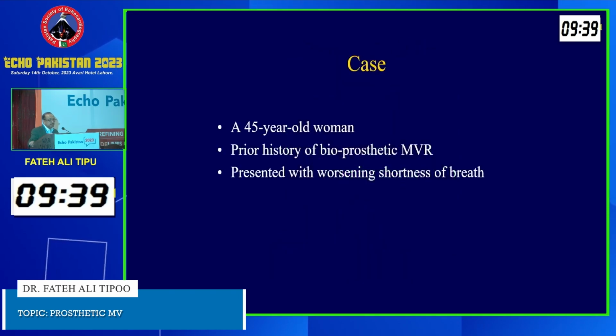The next case is a 45-year-old woman with a prior history of bioprosthetic mitral valve replacement, now presenting with worsening shortness of breath.